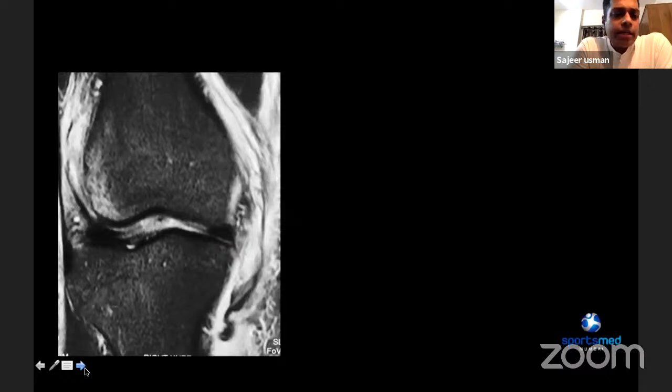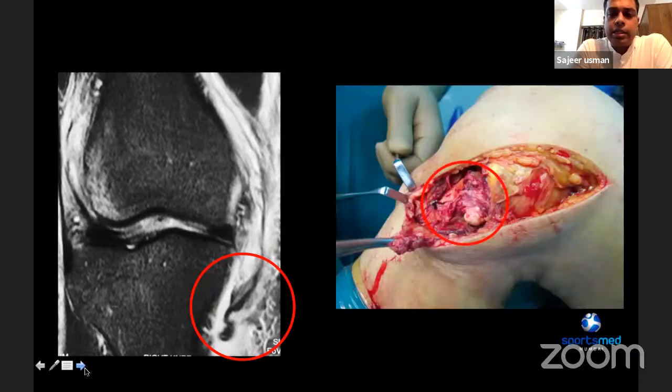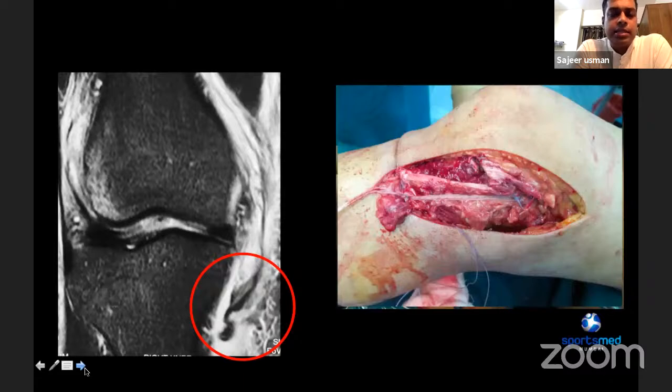Such injuries are quite straightforward. We know that the medial collateral ligament towards its tibial attachment is completely ruptured in this case, and it would be a straightforward case for repair, and with timely intervention we can reattach this to its native attachment.